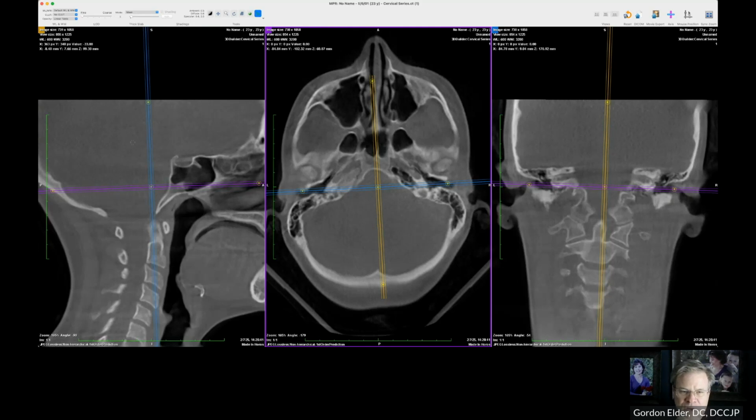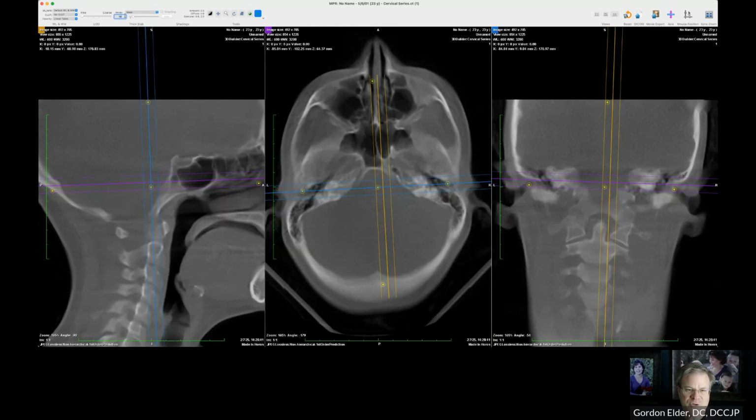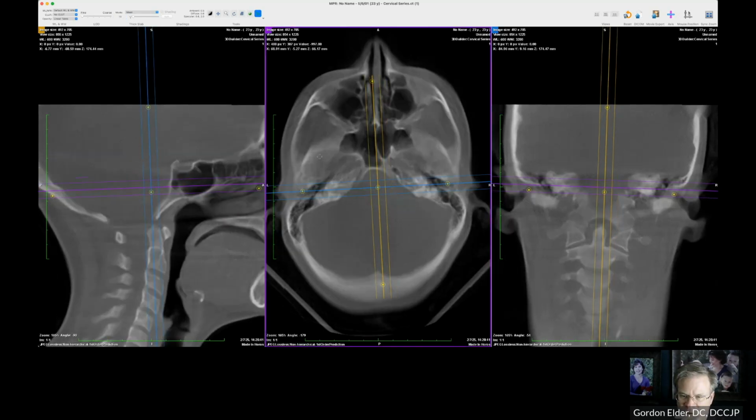So for right now, here we've got everything. What I'm going to do is I'm going to switch this over to 10. We're going to do some measurements. Right click on here, it comes back to center. I don't know why it goes off center. You notice it's off center on all of these, but none of these axes has rotated. So they're all still going to be good for measurement purposes.